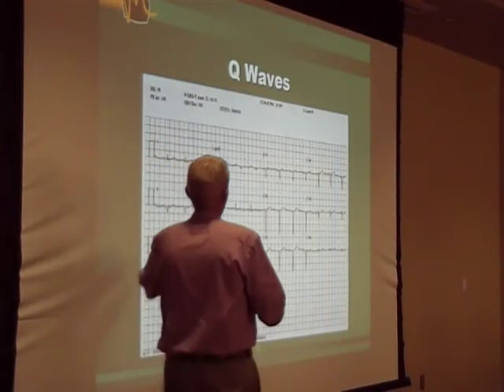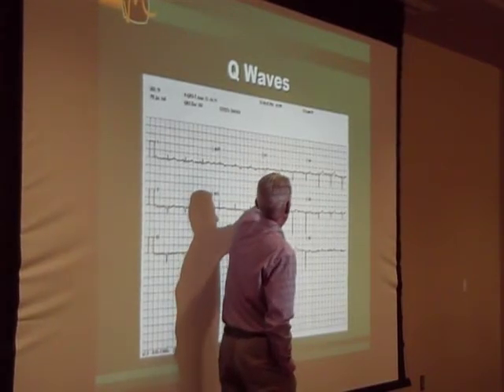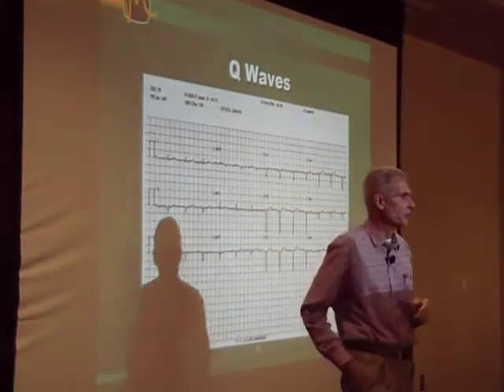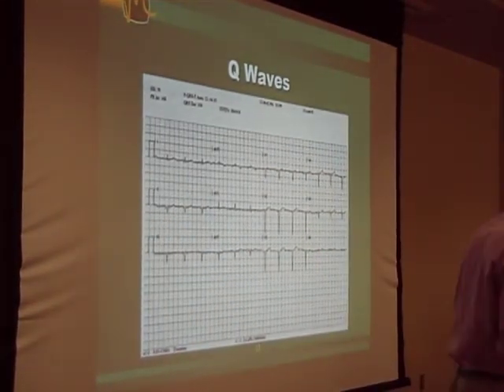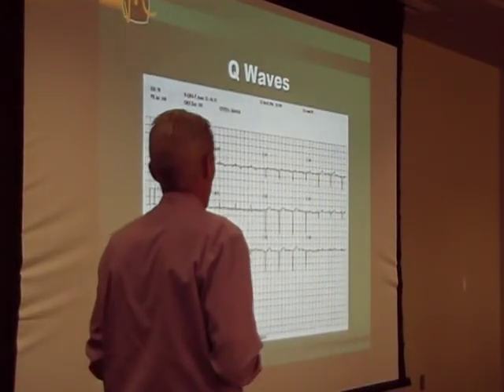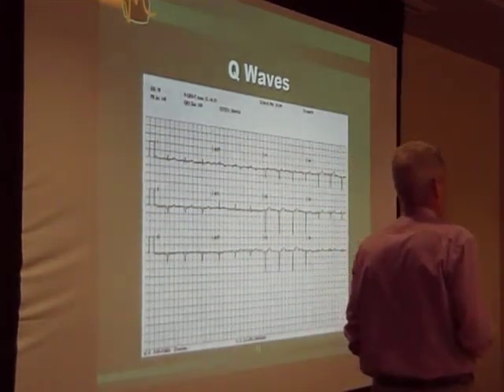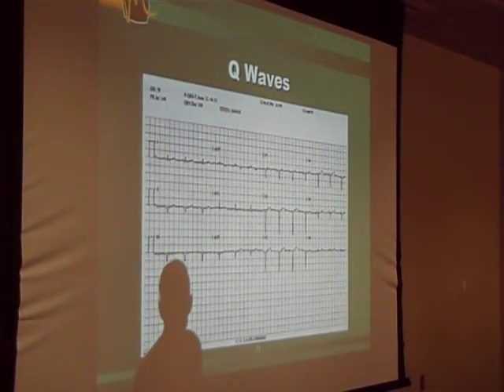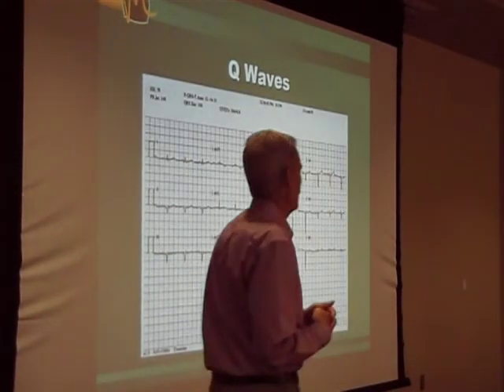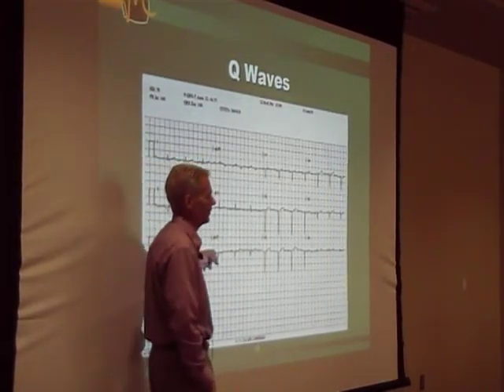So going back to what he said, if you look at the R wave progression in V1 through V3, it stays predominantly negative. You actually have a QS pattern, it's why. So here's an old anteroseptal infarct, and then there's one more. Where is it? Take a look at leads 2, 3, and aVF. What's wrong with those leads? They should be positive, right? We have a Q wave significant in 2, 3. Here's an old inferior infarct.